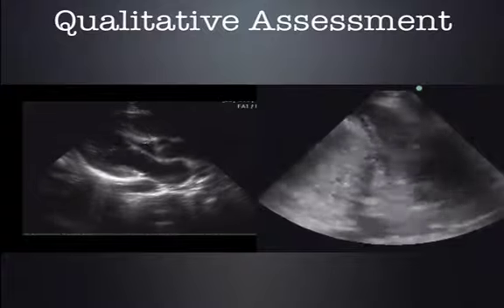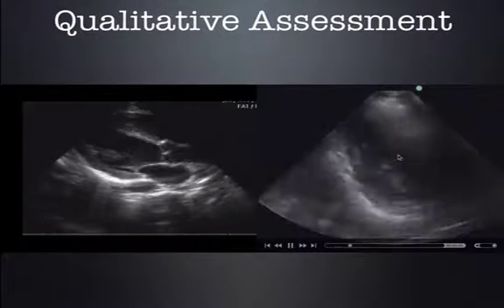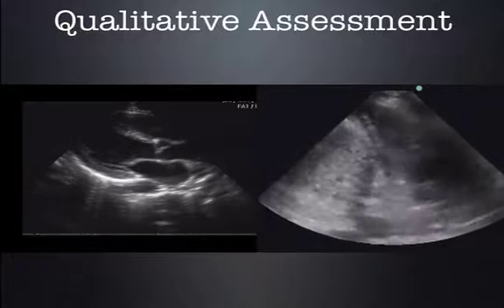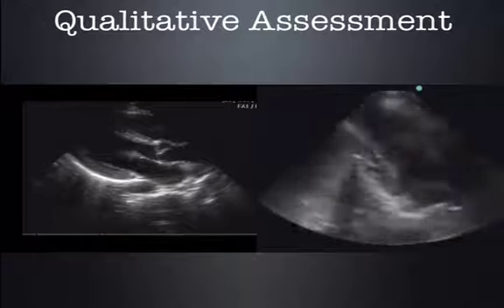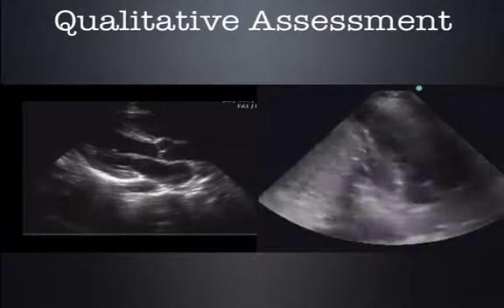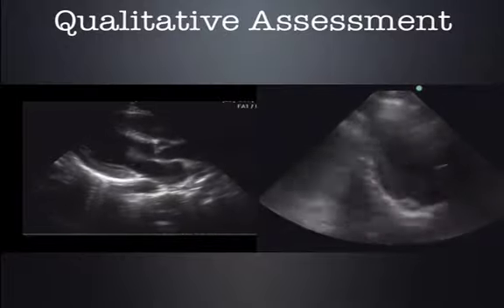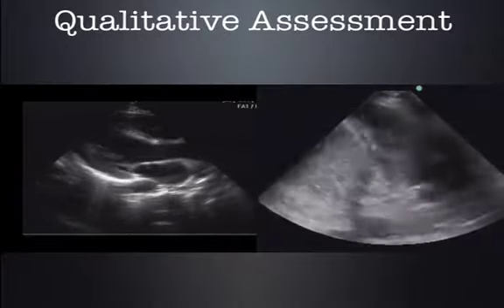So here's a comparison side by side. We have normal, hyperdynamic. Well, why do we care about ejection fraction? In the case of the hyperdynamic LV, as pictured here, this patient clearly needs more preload because their end diastolic volumes are so low. Now, if this patient has a pulmonary embolus that is obstructing blood flow from the right ventricle to the left ventricle, obviously they need lysis.